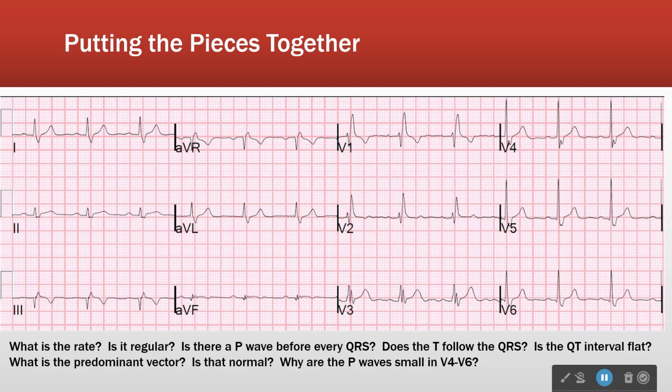No? A positive and a negative is a normal. Okay, so is that what we have here? So that first part would be the positive, and then the second would be the negative because it drops down below. So is that a normal axis? Yep, good. See, that was easy.